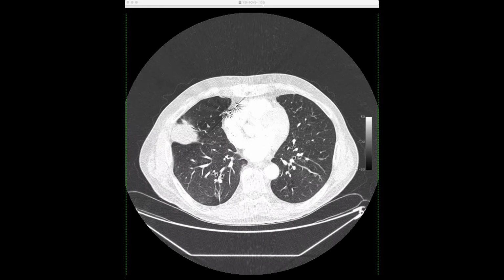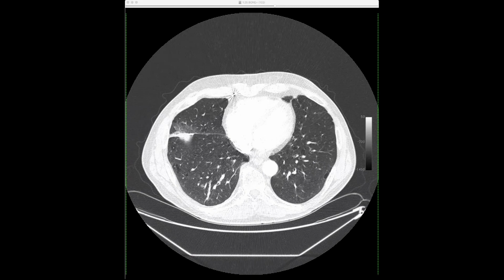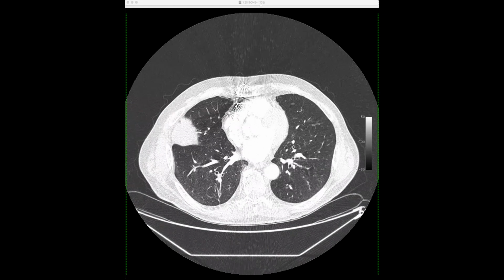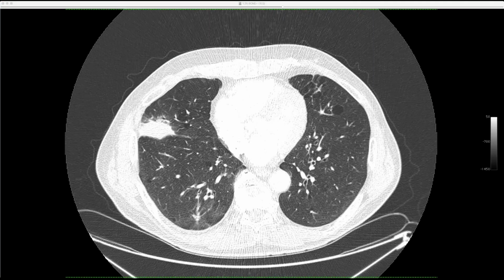Sort of the evolution of that, developing almost little cavitary sites around some of these cysts, or some of these solid nodules getting more solid. So variations of MALT lymphoma. So they tend to be very well defined, have air bronchograms, and they're often quite indolent, and sometimes they don't even treat them.